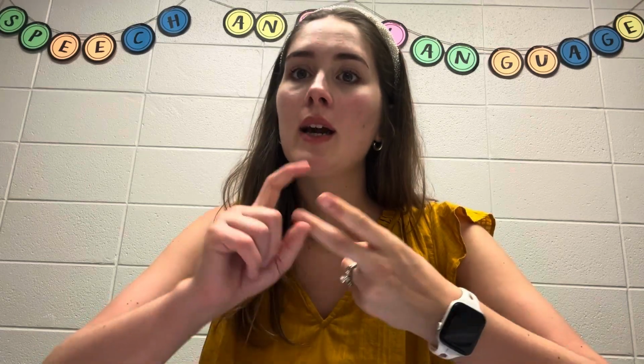So LAMP Words for Life is a software that you can download onto an iPad, and it's a form of alternative and augmentative communication, also known as AAC. LAMP was first developed to mimic how we speak and to incorporate motor plans. A motor plan is just a pattern that we have in our brain of how to do something. For example, if you're saying the word cat, for the k, a, t, your brain has a different motor plan for each of those sounds, and then it coordinates them together to make the word cat. It's very similar to how they designed this device to be.